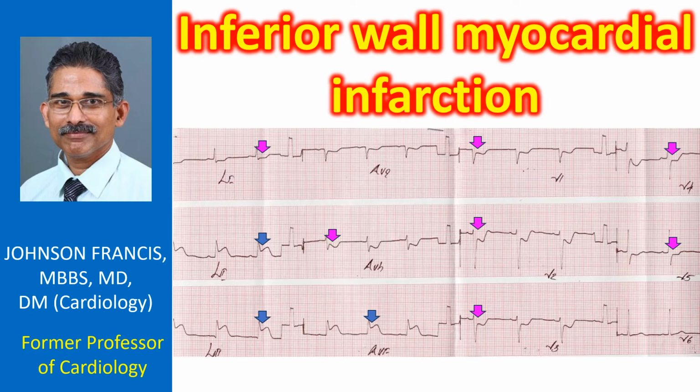The reciprocal ST depression in anterior leads could be just an electrical phenomenon due to ST segment elevation in the inferior leads or due to ischemia in the corresponding territory. We will see what exactly was there in this case in the still pictures of left and right coronary angiograms.